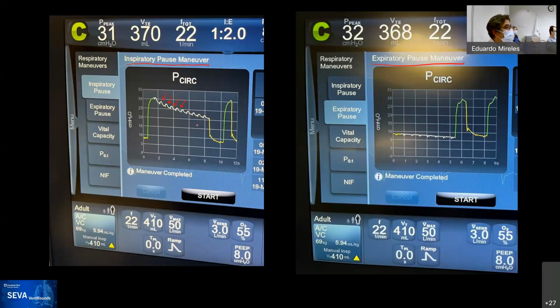Yeah, very likely cardiac oscillation. Good. So you see the regularity of these oscillations, and this is a common thing that you would see. Obviously, in this patient, if there's a leak, you usually see the frequency change as the leak occurs. If you have no movement, meaning there's no flow, can there be secretion movement? No, right? So that makes it more likely to be the case.